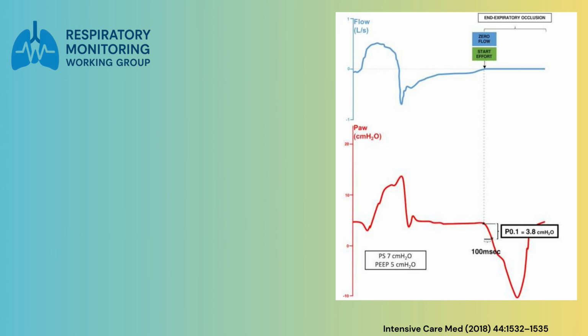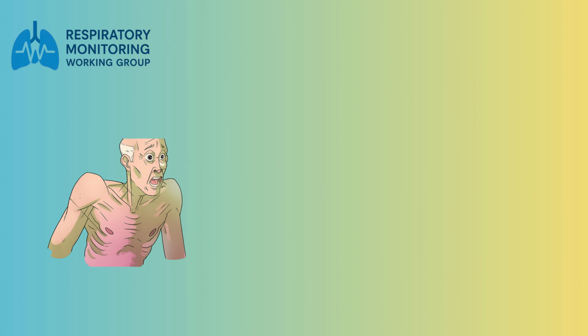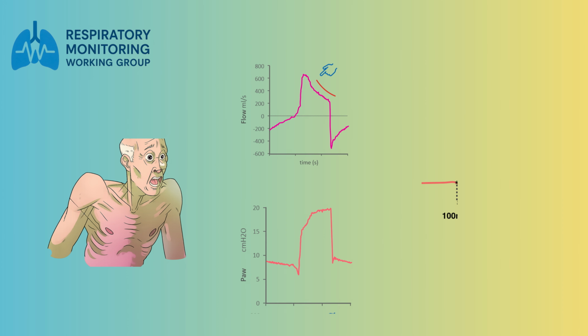In this situation, the operator should increase the level of pressure support to better match patient demand, while closely monitoring the patient's effort, waveform response, and the P0.1 value, to assess whether the intervention has improved patient-ventilator interaction.